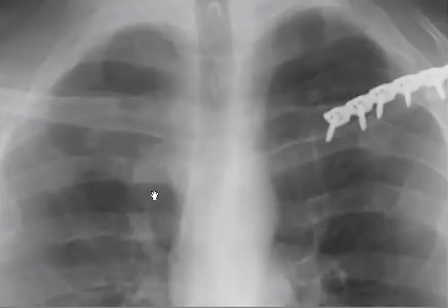So maybe post-traumatic osteolysis. So I will try to ask you something. If there is a trauma in the clavicle and they make fixation, do you see any abnormality in this patient? For example, if you compare both clavicles, do you see any abnormality?